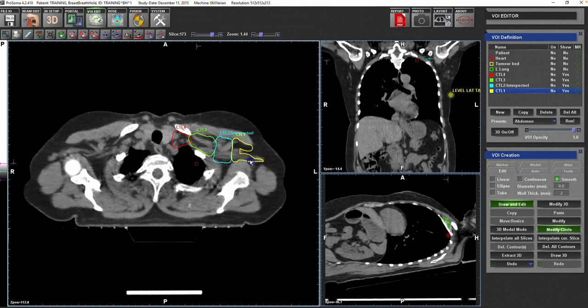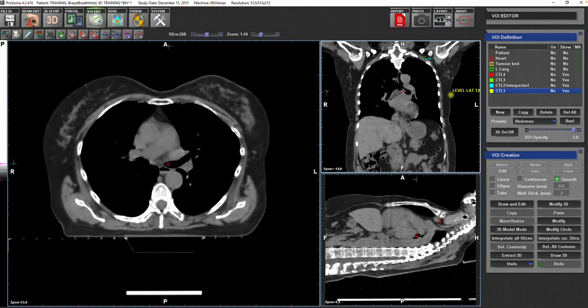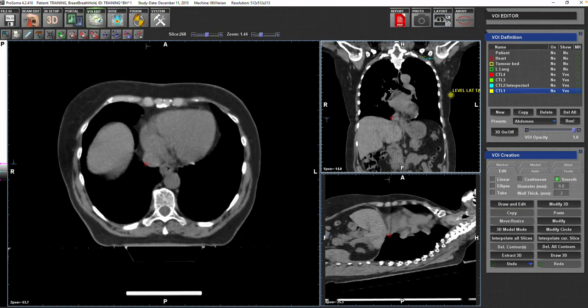You just get an imaginary line just touching the vessels, or keep it posterior to your line. And then another imaginary line joining the biggest muscles seen in this field, which are latissimus dorsi and pectoralis major. So I would do it something like that. Maybe it's not very accurate, but I will leave it like that. And then I will go down this time to where? To rib number 4. And that's why I wanted you to familiarize yourself with rib number 4.